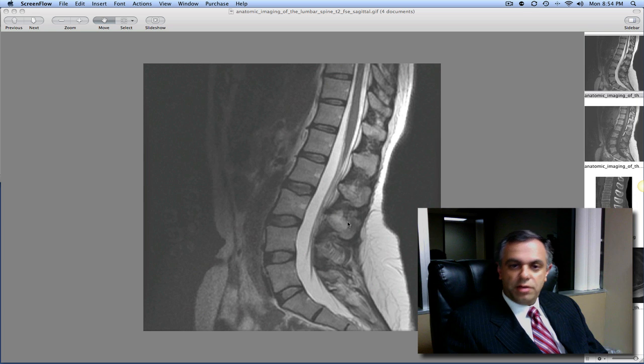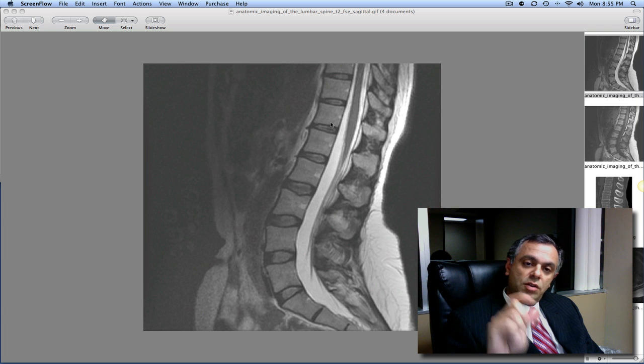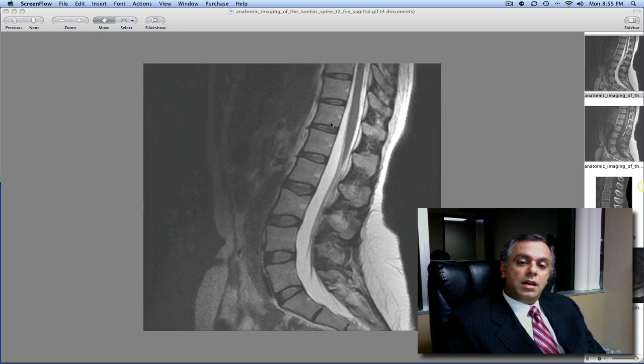The bones in the back are nice and straight. There's an open canal. Bones and discs are sitting here with containment within their compartment. And all the bones are tall without any fractures, and all the discs are tall and nice and hydrated without any bulge or herniation. And the discs and all the nerves are free. So keep in mind the fact that the spinal cord ends here and the nerves are down here, and that's where the sciatic pain can be from.